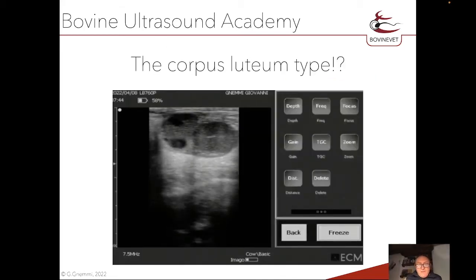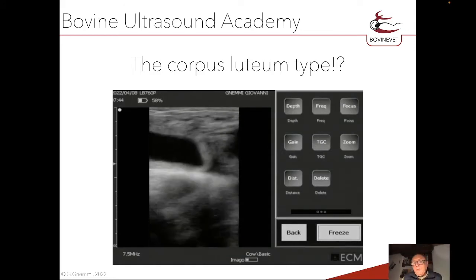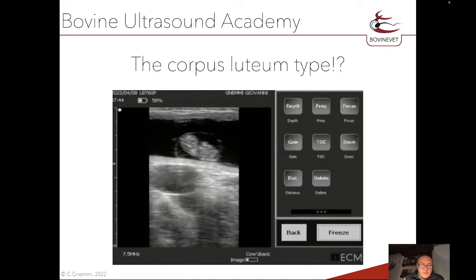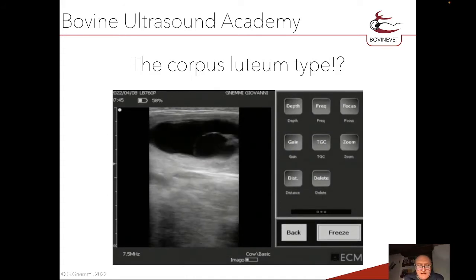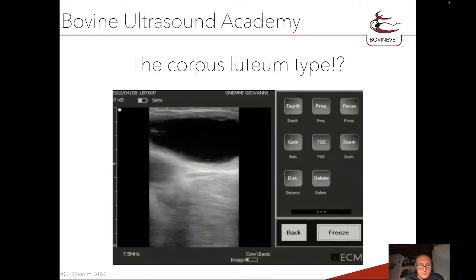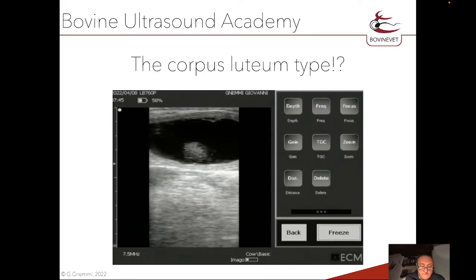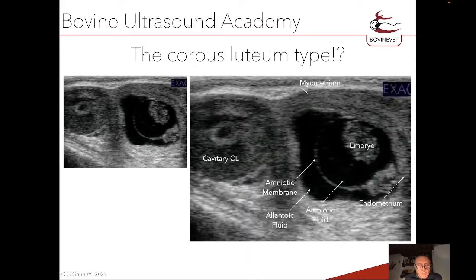Well, the cavitary corpus luteum is thought by many to be a second class corpus luteum, a corpus luteum that produces an insufficient amount of progesterone. However, this is not the case. Between 35-70% of the corpus luteum in the dairy Bos taurus during the first 10 days of the cycle have one or more than one cavities.